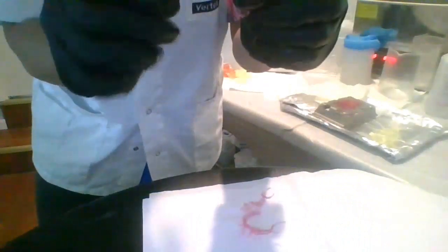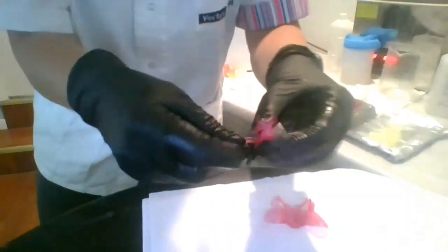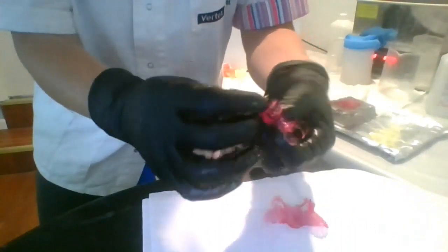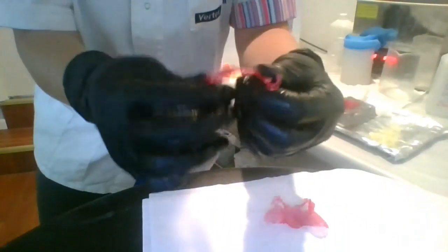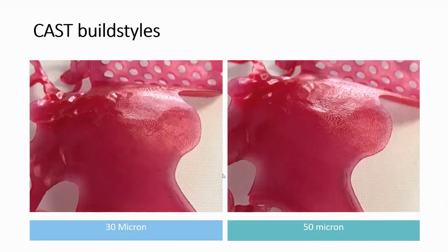So Stein is going to show you up close the detail between the 50 and the 30, and you can see that it doesn't affect that detail that you get on the palatal. Yeah, so here on the screen, you can see on your left side the 30 micron build style that we have been using for a long time, of course. And on the right side, the 50 micron new build style.